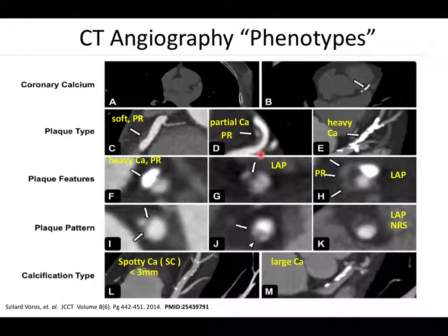of lesion it is. And here we have purely detected soft plaque that has a bump on the outside of the vessel. So the geometry of this lesion is called positive remodeling, or PR. It bumps on the outside, and it's like a fibrous tissue or lipid-filled core here, which grows on the outside. No calcium in there, so it's a completely soft plaque. You wouldn't see it on a calcium scan. These are not good. They're young and they're dangerous, these lesions.